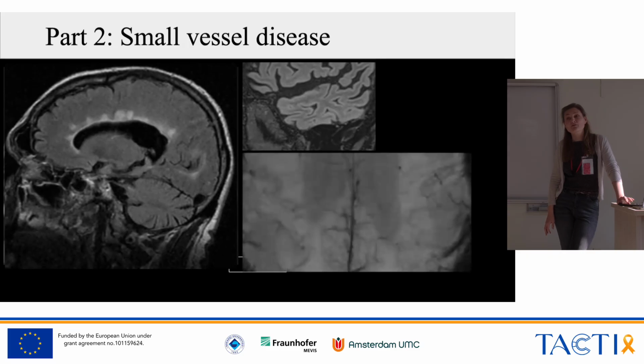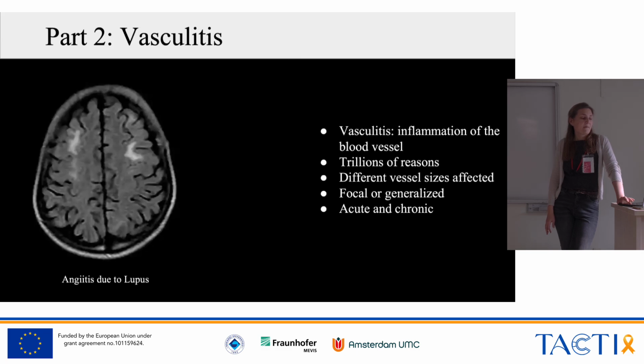And of course, we look at the central vein sign if we can. So if our lesions show a central vein sign, it's more indicative of MS, less indicative of small vessel disease. So this is our biggest enemy you've met of all the not related conditions.